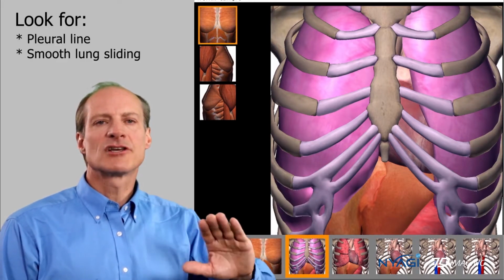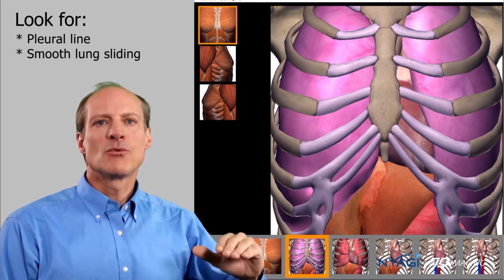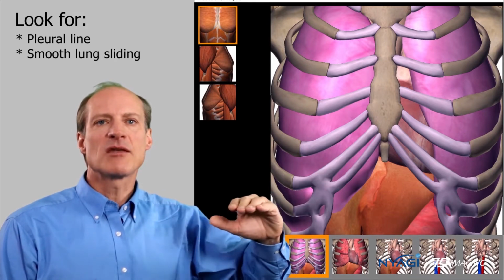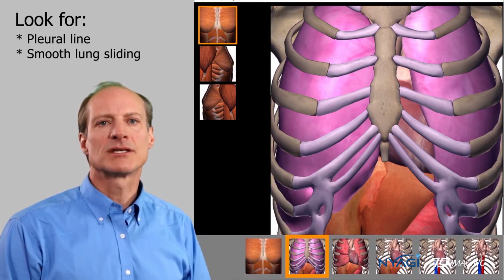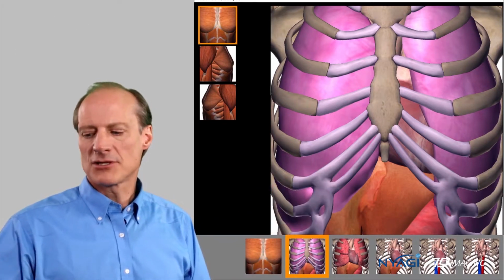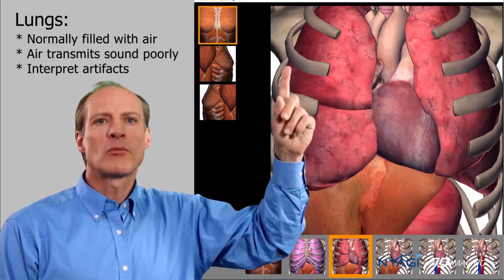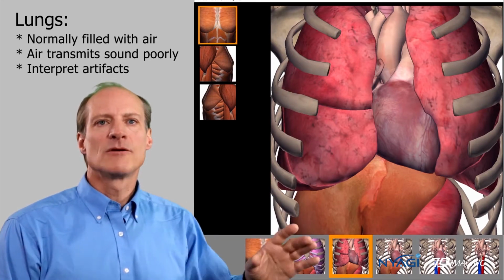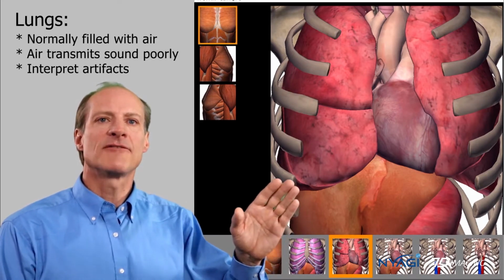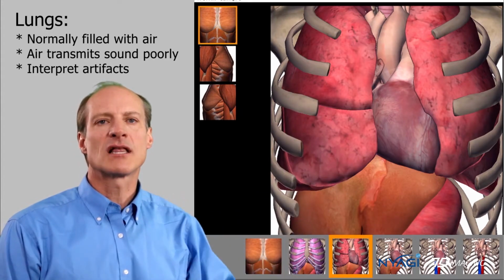The two layers of pleura slide on each other smoothly in a normal lung. With COVID-19 virus, there may be irregularity or even non-sliding of the pleural spaces. Deep to the pleura is the lung tissue. Normal lung is filled with air, so you usually don't see it on ultrasound. We use artifacts to determine if the lung is filled with air or fluid or even consolidated.